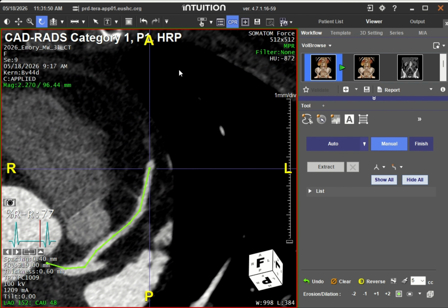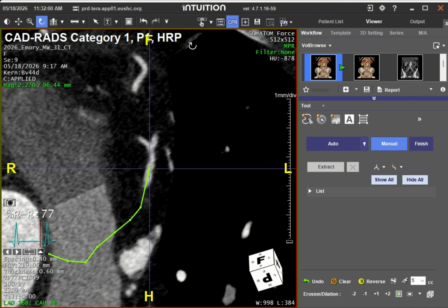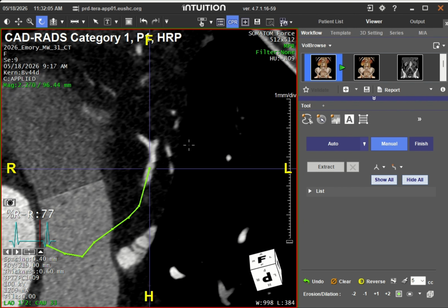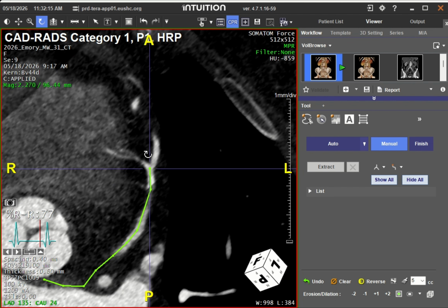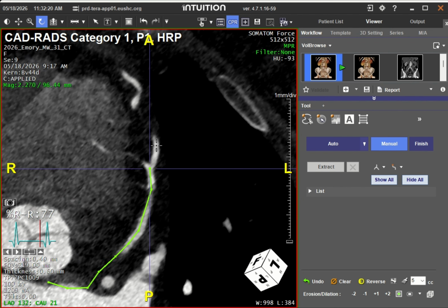And then we're going to rotate again by holding down the left mouse and pushing the mouse away from us again. So that's exposing more. So we'll go here, center again, and then rotate by holding down the left mouse button and panning the mouse to the right.